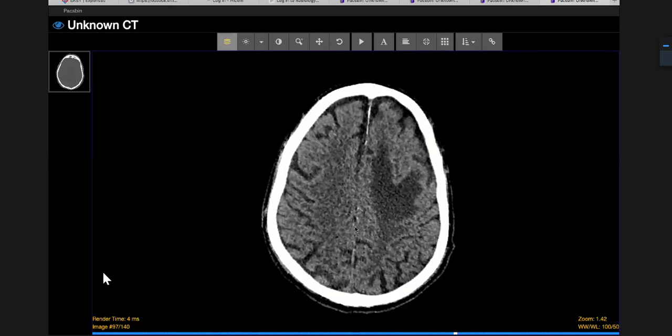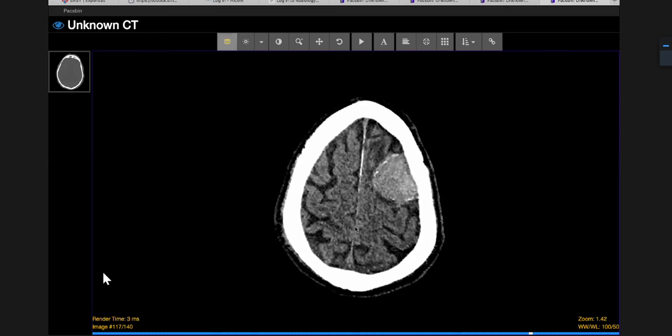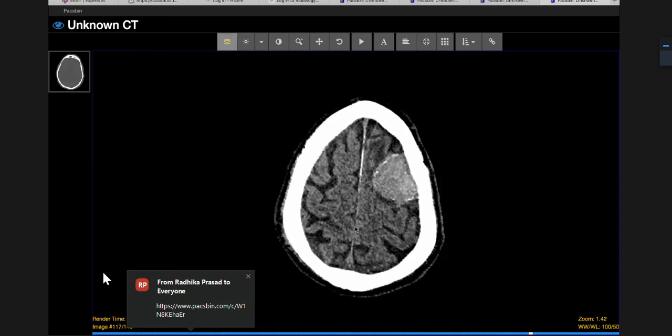So I believe this one was resected, and hopefully that vasogenic edema then resolved. But you described all the features there of a meningioma, and I think again this would be like an opening case, just a starter to get you comfortable in the Viva seat. Okay, here's another case.